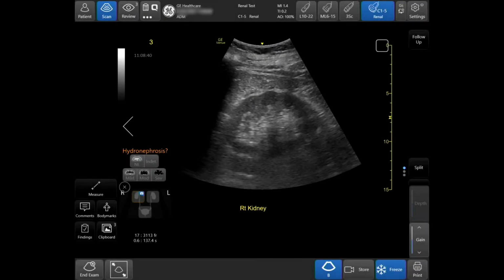The renal diagram simplifies documentation and supports easy follow-up for patients with suspected hydronephrosis. No need to manually type findings. You can simply assign a label from a pre-populated list that corresponds with the grade of hydronephrosis, providing a quick assessment and review of the urinary system.